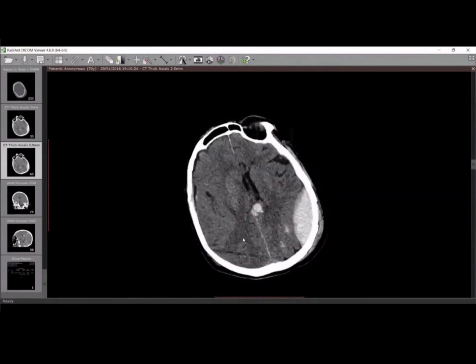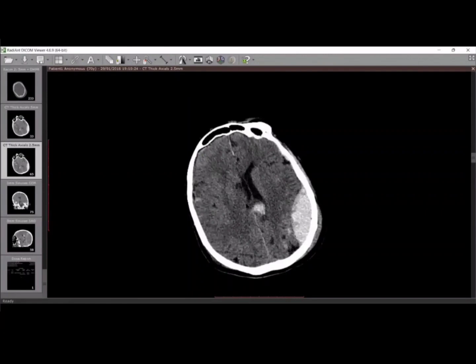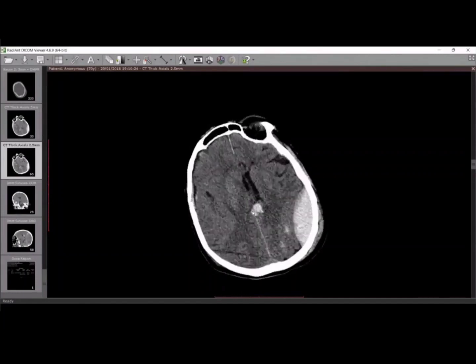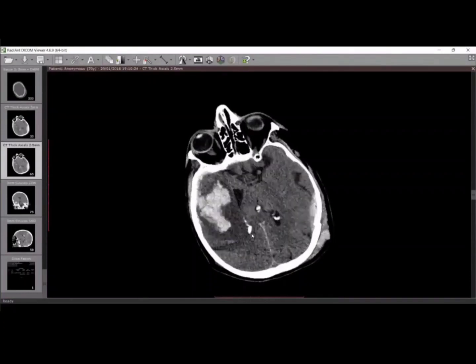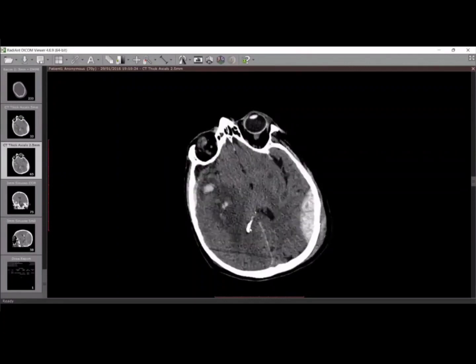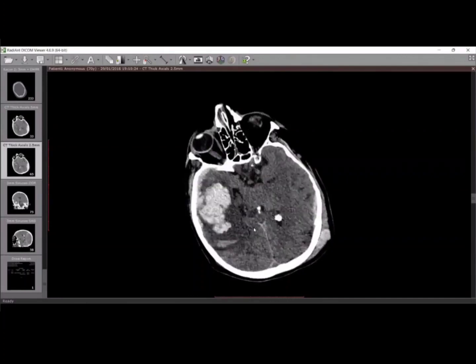Now I'm going to concentrate on the herniations. I have already described the midline shift to the left. I'm looking, and there is subfalcine herniation towards the left. There is effacement of the right lateral ventricle, and the left lateral ventricle is asymmetrically dilated. There is high density in the right lateral ventricle, but this seems to be calcification rather than hemorrhage. I will check the density on the console, but I will double check on the workstation.